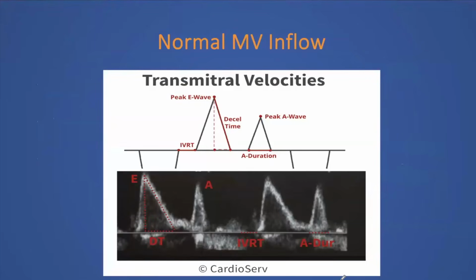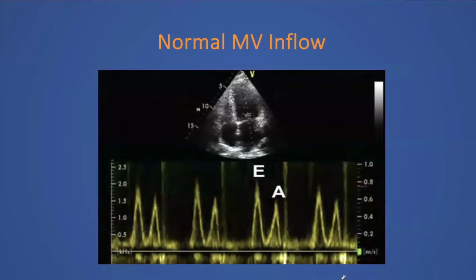We use it for two reasons. One is, from time to time, if we want to calculate the stroke volume through the mitral valve, we can use it just to see how much is the regurg and these things. And the other one, which is really uncommon, is for atrial wave duration and diastolic dysfunction. However, I don't advise that, especially in the presence of Dr. Kim. Okay, he doesn't believe in it. Yeah. So you saw his hand, like, never do it.